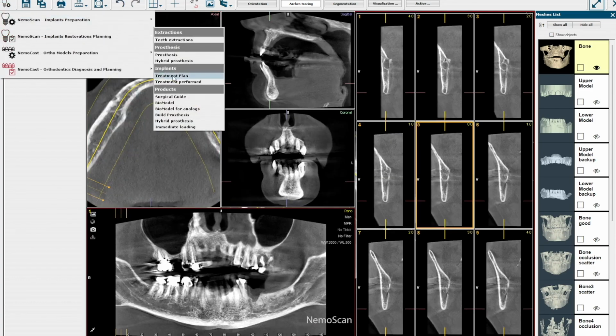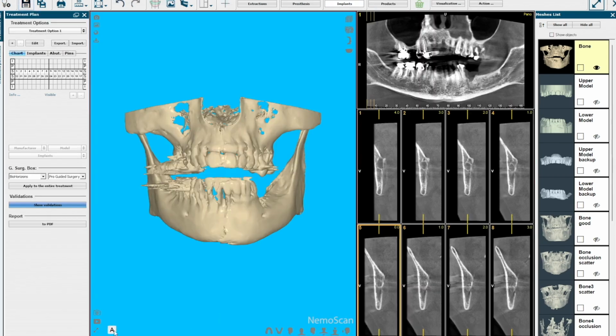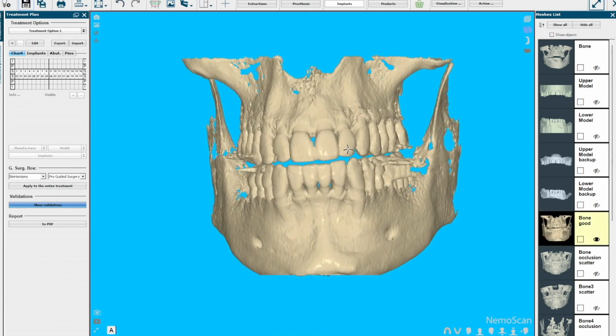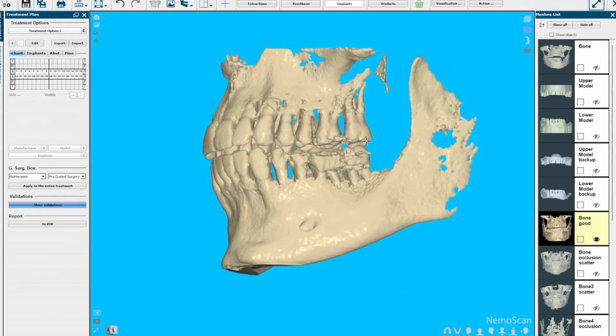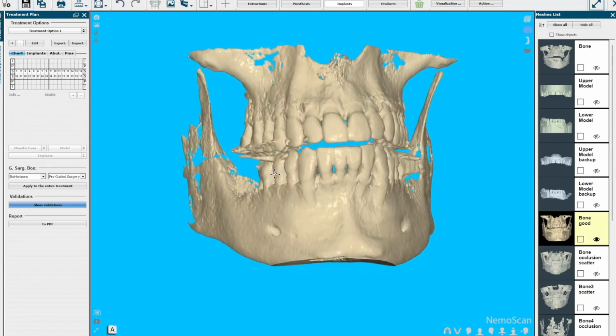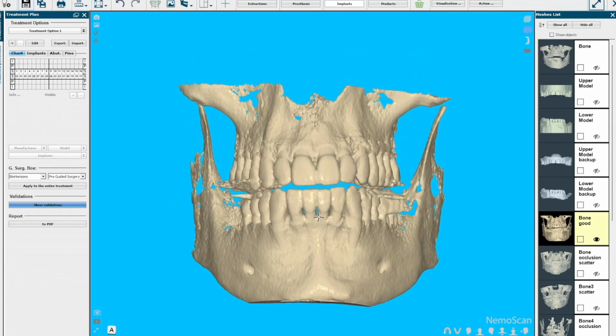So to finish things up here, just real quick, I'll show you one more good example of a great CBCT. Patient is out of occlusion. We're able to see the cusps of the teeth. There's not a lot of scatter. So all of those things are necessary. It's not hard to do, but just make sure that we do it properly so that we're able to get an alignment with the STL file and that we're able to perform a safe and effective surgery.